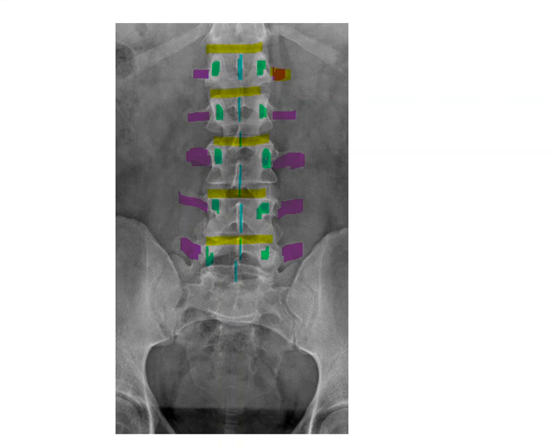Another thing that we can look for is the SI joint, the sacroiliac joint. This is the sacroiliac joint here, where the sacrum and the ilium articulate. I'm just going to continue this out to show you the outline of the sacrum here. It's the base of the sacrum there, where L5 sits on the base of the sacrum. All right, and then I'm going to use a little bit more purple and show you the ilium. It should be a little more rounded there. All right, and there's the ilium.